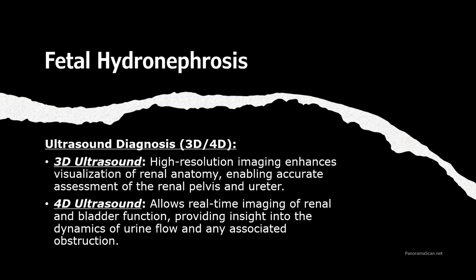By visualizing the movements and the changes in the fetal kidneys and bladder, 4D ultrasound can aid in distinguishing between obstructive and non-obstructive causes of hydronephrosis. Using these advanced ultrasound techniques allows us to monitor the condition more closely and plan for the appropriate follow-up and management.